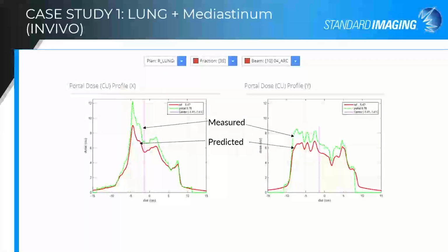We take a look at our other information in Adaptivo. It also gives us a view where we can get essentially the profiles with the reference. This is the predicted signal on the panel versus green, the actual measured signal. So with that measured signal, we can see that it's actually higher, which correlates with the hot gamma that we were seeing versus cold. So the signal's higher. This gives you some idea of the amplitude or magnitude of that disagreement.